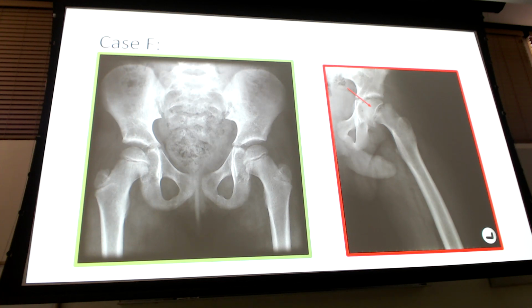Go ahead. On the greater trochanter, is that a physis or is that not? So yes, it's peds, right? But again, don't look for the growth plates in other areas, because remember I told you different growth plates fuse at different ages. And I'll be honest with you, I think 15 is close to that age when the trochanter kind of fuses. So maybe it is here, and in some 15-year-olds it won't. So don't get hung up on should there be a growth plate or not.